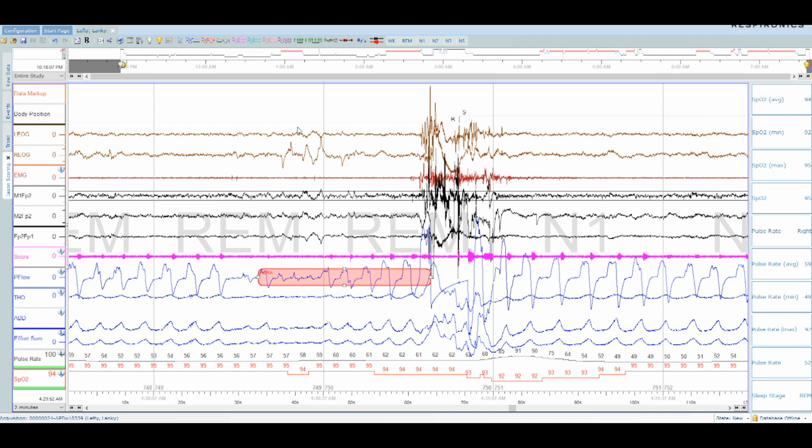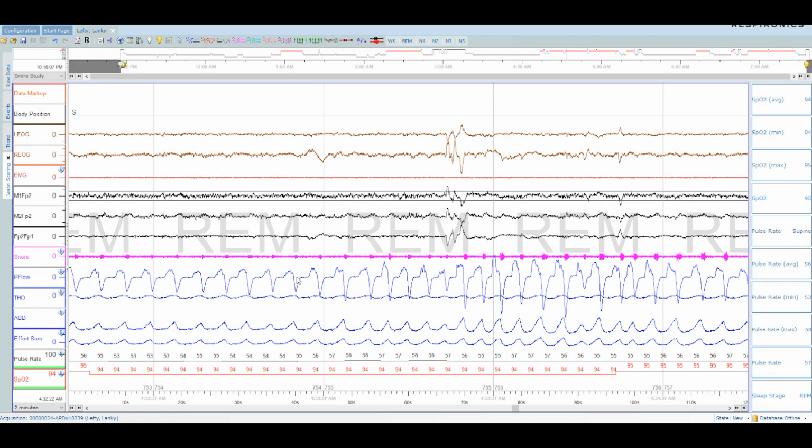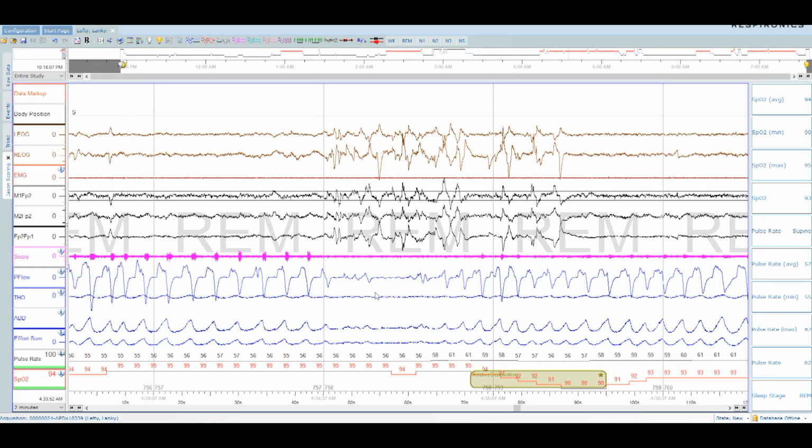So, yeah, interesting. We have another point here, guys. Who has done a PAP analysis with me and knows that flat line, and then what happens with the flat line? Little position change. Guys, I'm not making this crap up. You know what I'm saying? No, I do make some stuff up, but just not this.